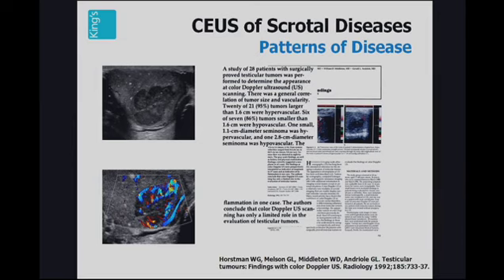An indication of malignancy is therefore the presence of hypervascularity. A benign lesion should demonstrate no increase in vascularity. This is the hallmark of investigation of the focal testicular lesion with an ultrasound examination. If we can add contrast-enhanced ultrasound to this pathway, bearing in mind that contrast-enhanced ultrasound exquisitely demonstrates the vascularity of the lesion, we should perhaps be able to ascertain whether or not a lesion is malignant or benign, entirely based on the vascularity.